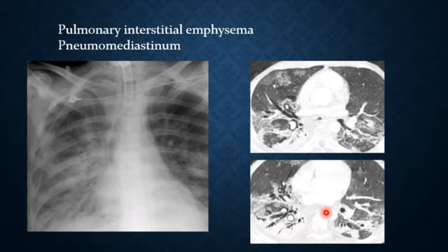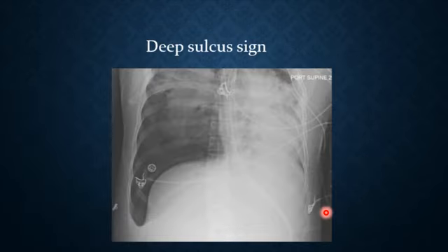Now, another sign that is, I think, one of the famous signs is the deep sulcus sign. Okay, what does this deep sulcus sign mean?